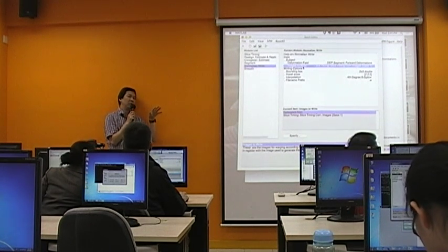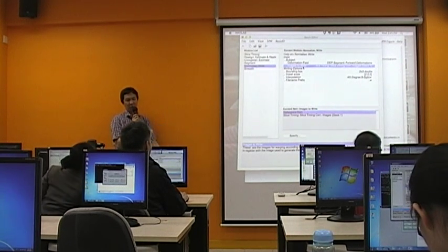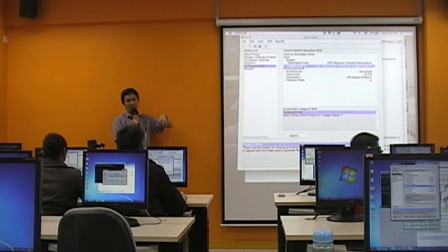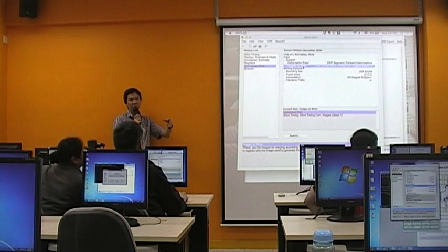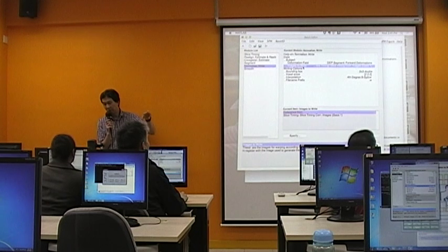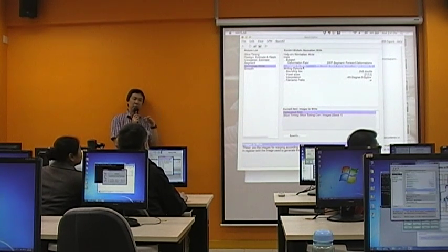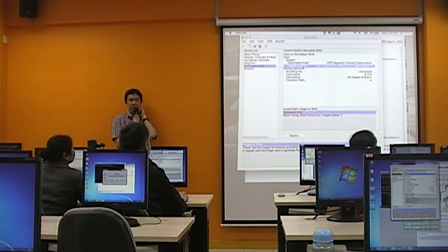Which is the realigned images, right? So first of all, you do slice timing correction on the EPI, on the functional image, then you correct for head movement. So after that point, you haven't really touched the functional image, right? They are stationary. Now you want to bring them to the standard space. So that's why the images to write should be, in this case, after realignment. So the output of the realigned functional images should be the input for this normalization step. Okay?